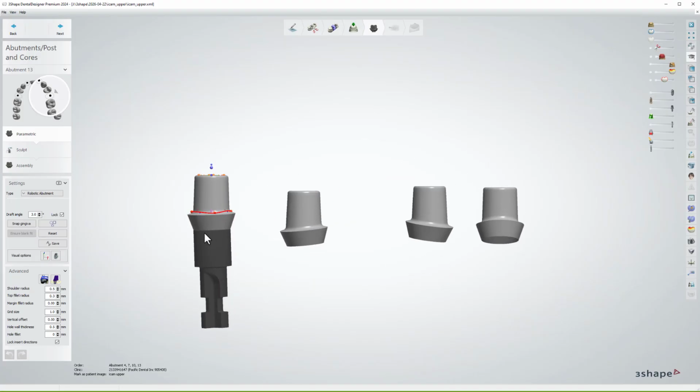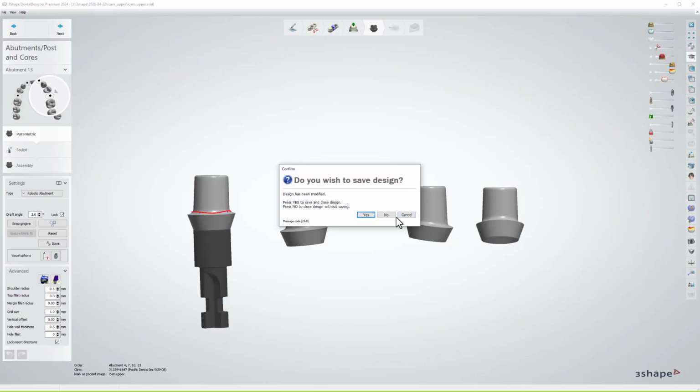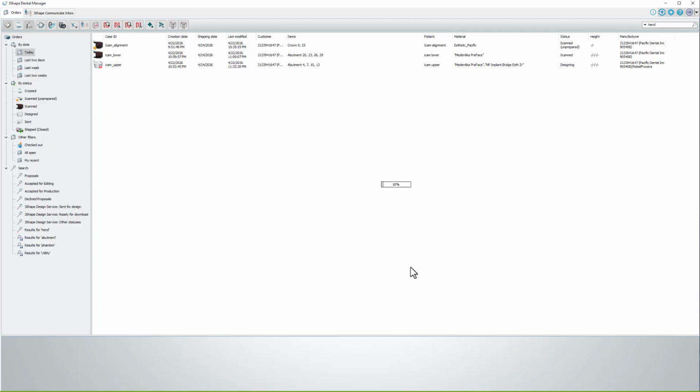Because the Icam data, the discs in that Icam data you saw that I aligned to the scan, those are the implant coordinates. So it's not changing. They're all injected, aligned with the Des scan body. It's now in that scan. So there we go. That is my take on how to do it in 3shape.